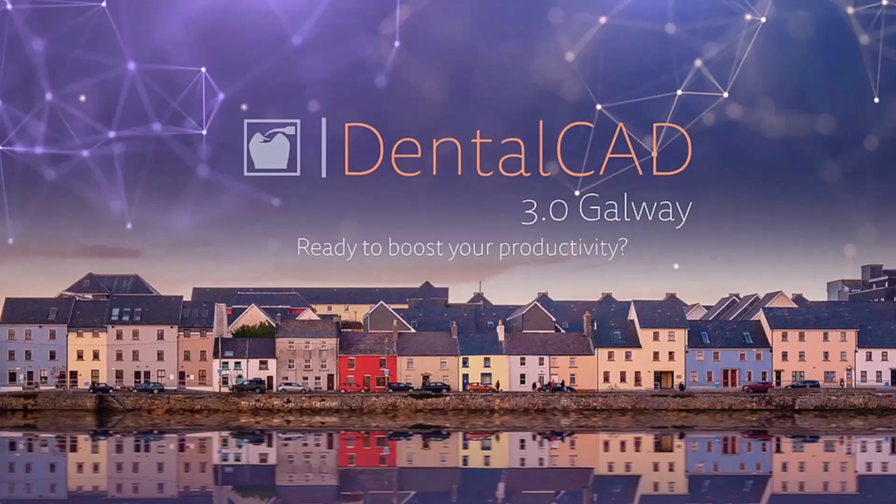Hello, today we have a step-by-step video about designing an upper left first molar zirconia crown in Exocad. This video was recorded about a year and a half ago, so I'm doing a voiceover today. If there is anything new I would have done better, I will for sure say it in this video. So let's start our design.